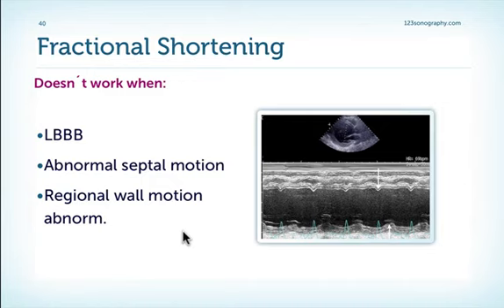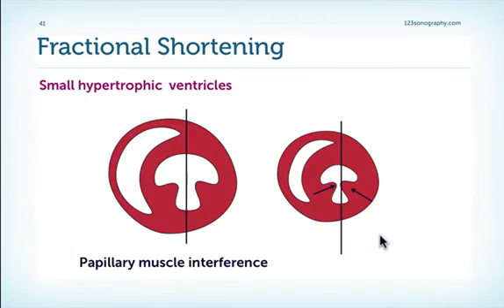because this can lead to either over or underestimation of ejection fraction or fractional shortening, depending whether you have the region of infarction or regional wall motion abnormality within the ultrasound beam or not. Another problem that you have to be aware of is a methodological problem. Especially if you have small left ventricles, you could get lateral portions of the myocardium, and in particular the papillary muscle, within the field of the M-mode, and thereby this leads to a pseudo shortening of the left ventricle, and thereby you would overestimate ejection fraction. So this is another problem that you have to be aware of.